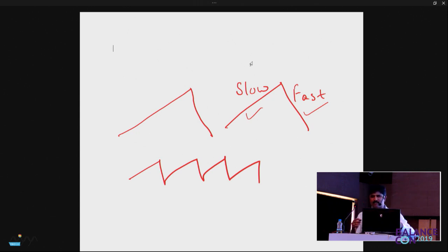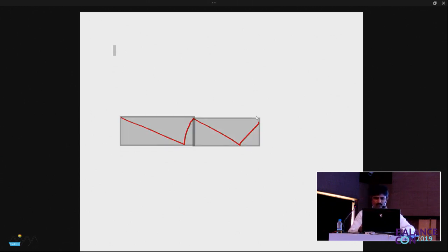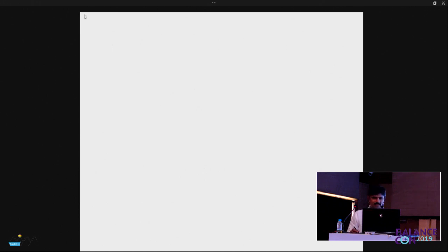So I will draw some things. You tell me what it is. What is this? This will be a right beating nystagmus. Is that right? So this is a right beating nystagmus. Now we will build on something else.